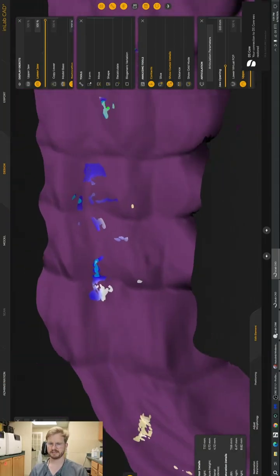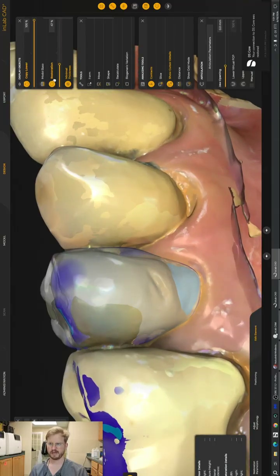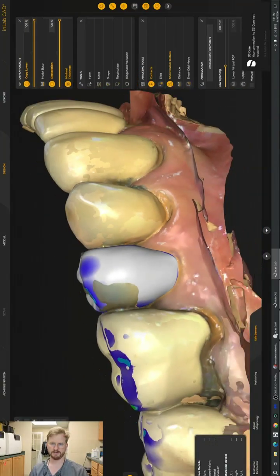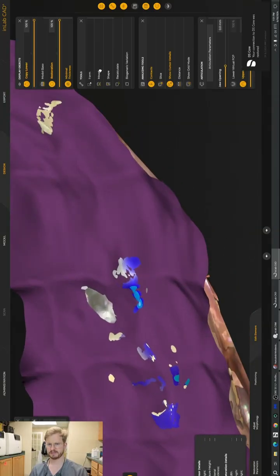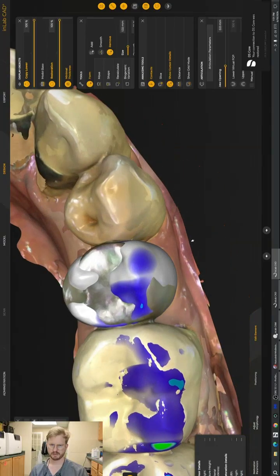So this tells a story as to why her old tooth had a flat part to it, right? It's like we can see how flat that cusp is. And then my proposal wanted to lengthen that. But if we make it taller and she functions, it's going to have an interference. We don't want that. So form remove. Let's get rid of it. That looks better.